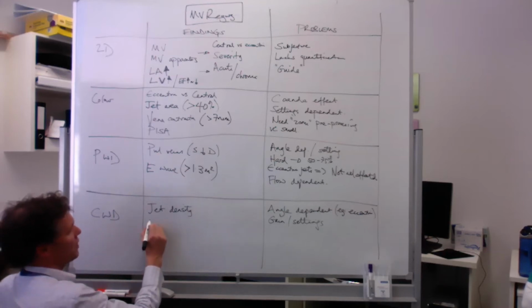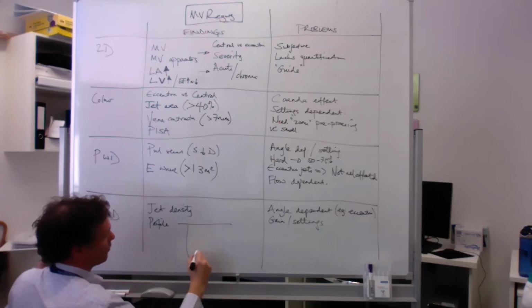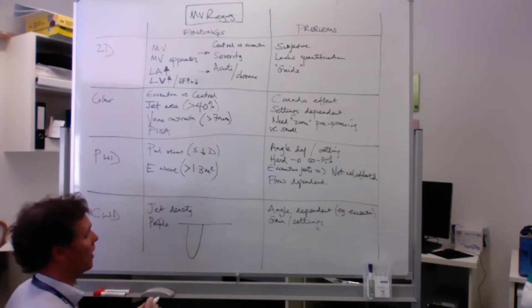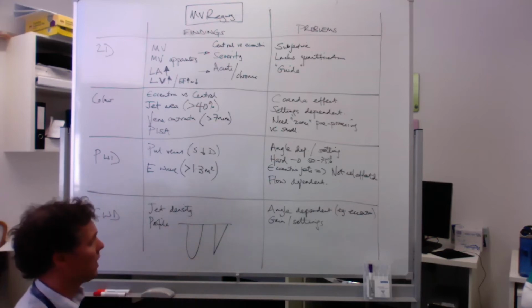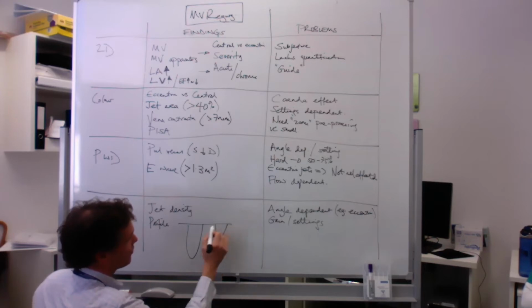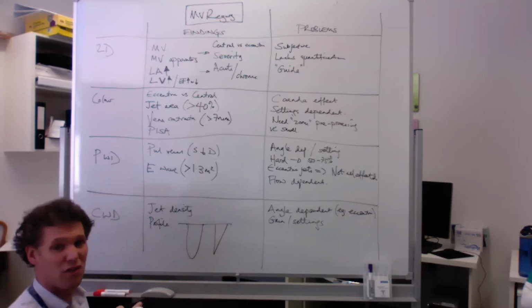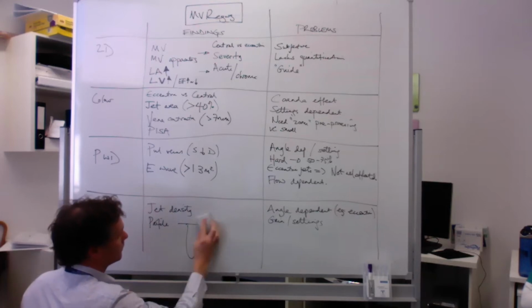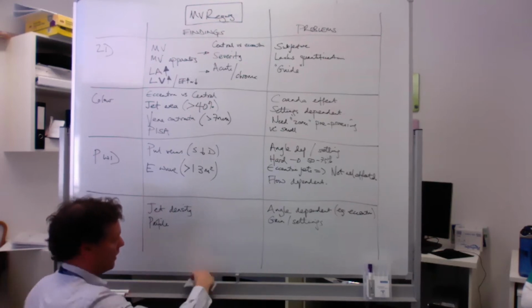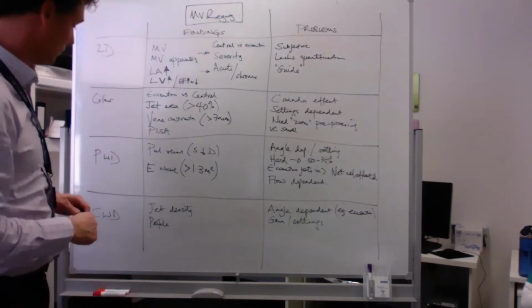I was also going to say the jet profile. So I guess a normal one would be a parabolic flow like that. If it goes in that, the cutoff sign with early equalization of pressures, so it ends a bit sooner. So the early equalization of pressures, the cutoff sign, that can indicate severe. And the big one: volumetric assessment with pulse wave Doppler.